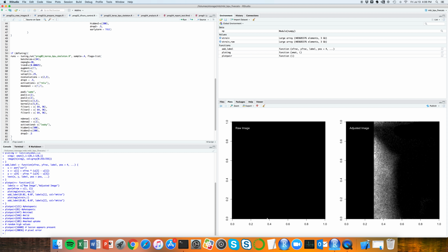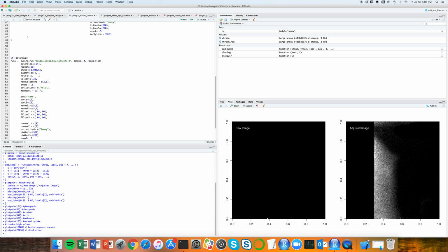A tuning run looks very similar. The difference here is that you're able to pass in combinations of values to be used to form a grid search, and then you can sample from that grid a certain proportion. Now, where this program is now, it's gone through multiple iterations. So we've trained, we've learned, we've narrowed, and we're down to really a small set. When we first started off, we had a much larger array as well as a different sampling fraction.